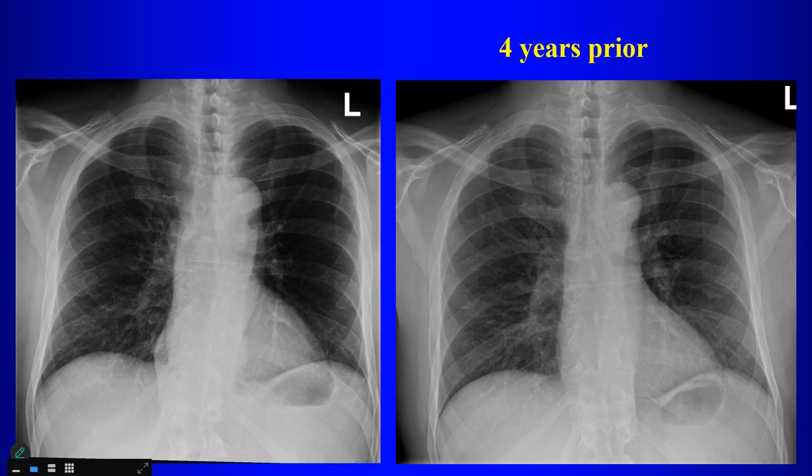So there's retrocardiac, like, when you compare this x-ray to that x-ray, what looks different? There's deviation of the left paravertebral line. Okay, so here, right, there's deviation of the left paravertebral line, right? What is this guy over here? Heart border. That's the right heart border, right? What is this guy over here? Is that the right heart border?